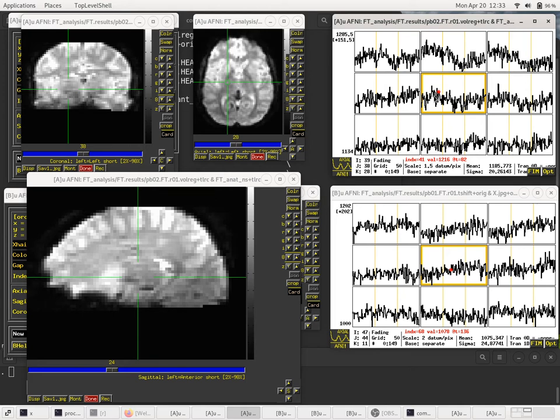So some of the slices are kind of in the right place, some of them are not. How does 3D volreg correct this? It can't. It can't account for the fact that the slices are acquired at different angles. Even if you try to correct for that, you don't have data where you are supposed to have data.